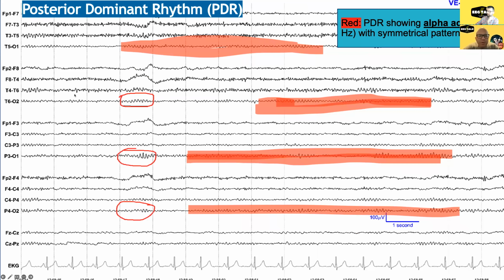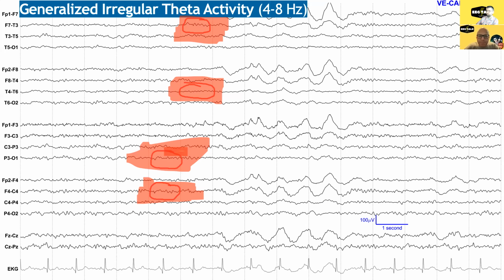Seizures sometimes do that. They also will kind of smoothly evolve in maybe their frequency. They can spread to other parts of the brain, or we'll see some examples later. But this is what we would call just kind of, well, don't want to say normal, but it's not seizure-like, it's not rhythmic, it's just run-of-the-mill theta slowing, irregular theta slowing.